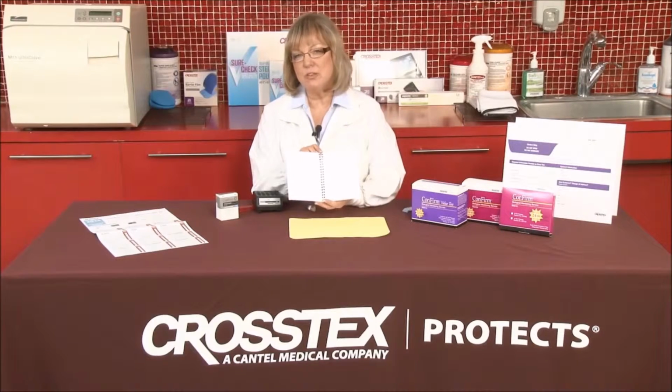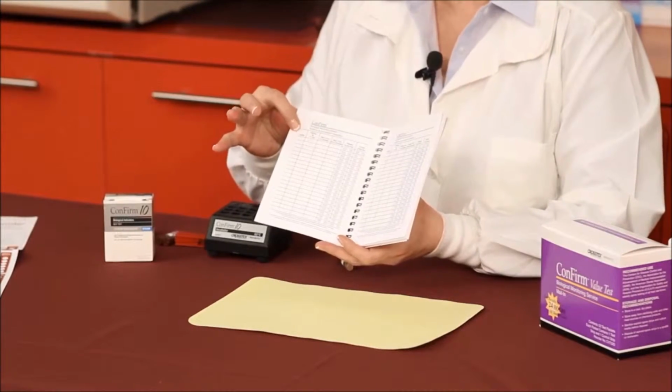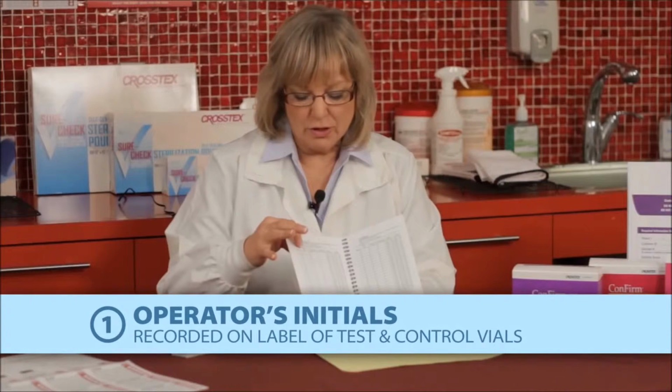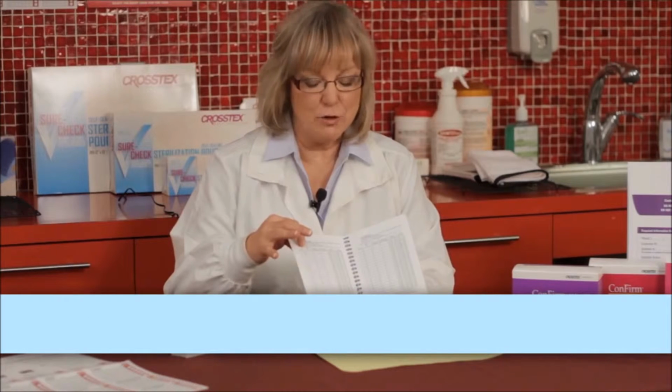And it's important that you use either black or blue ink. You would not want to write into this document with pencil. The first thing that it's going to want to know is the operator's initials, which you've recorded on the outside of the label on both the vial and the control. It's going to want to know the sterilizer number and type, however you've identified it in your office.